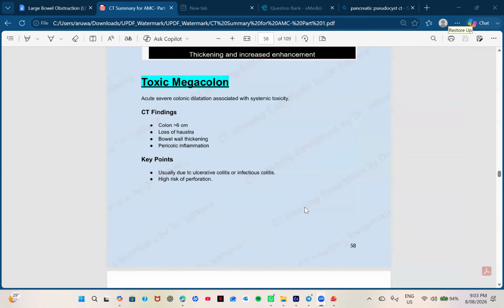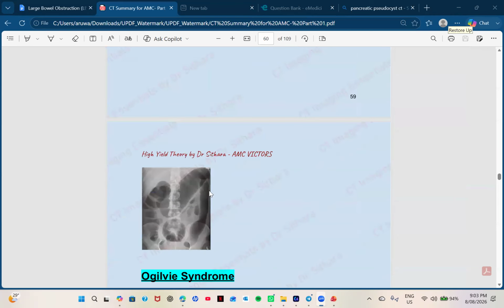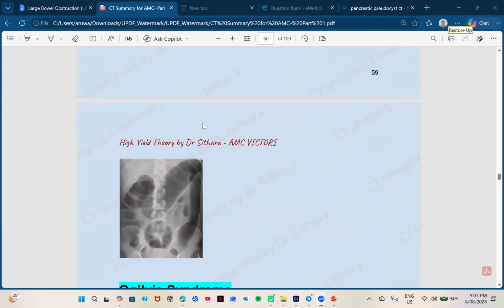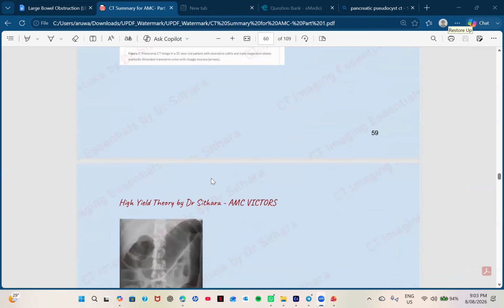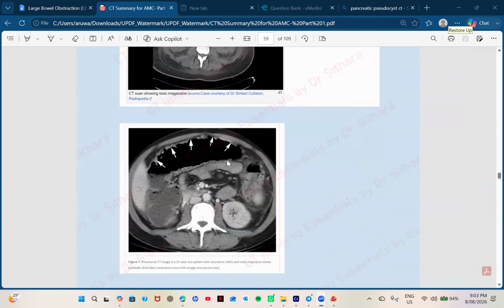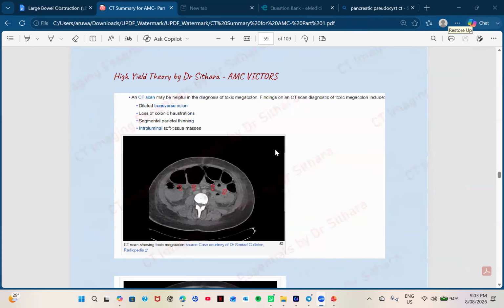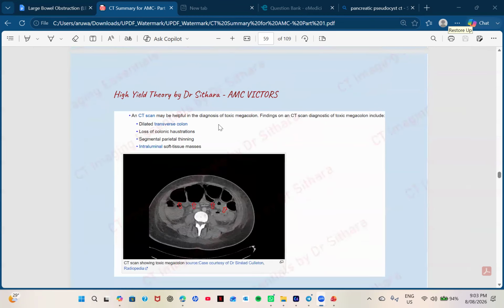Like that. So the toxic megacolon, usually we can find it on X-ray, right? Typically on X-ray, the highly dilated colon you can see, right? Toxic megacolon. Other than that, in here also you can see the dilation, right? You can see the bowel dilation, the bowel can be very severely dilated, right? Here can you see, like that.